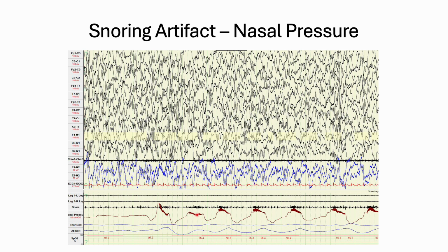So that's what that stuff is. A lot of labs have filters, and they don't include this stuff with the nasal pressure. They just want a nice up and down, where that can get rid of a lot of artifact, but it can also really mess up your signal too, so you're not really looking at real breaths.